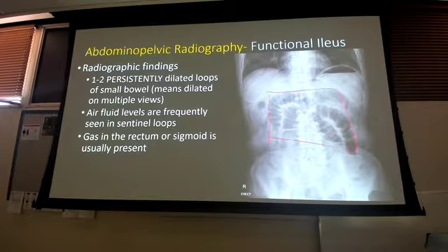It's all pretty centrally located, right? And I can't even say it's centrally located because I have organomegaly, because the spleen's not coming past the 12th rib, liver looks pretty good here, right? It looks like it's pretty centrally located. On top of that, I have multiple loops sitting on top of one another. Think about the small bowel, how it does that. It lays all over itself and on top of one another.